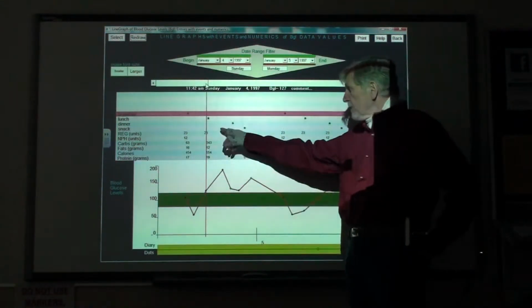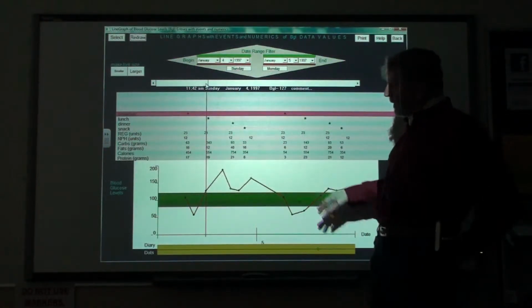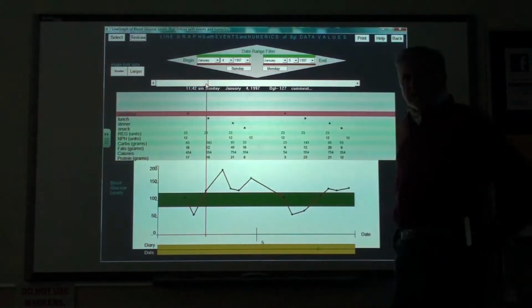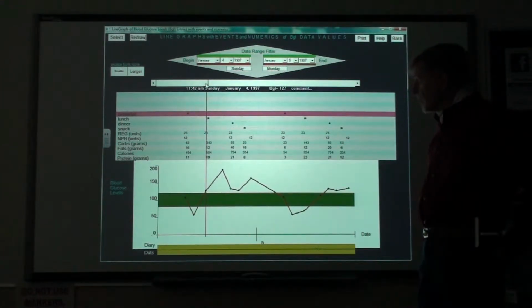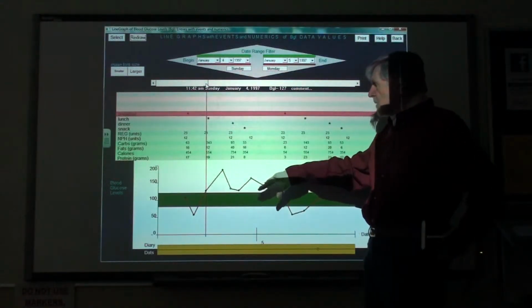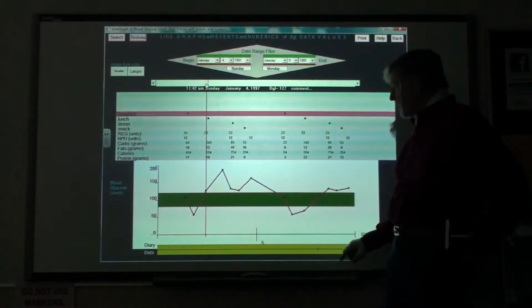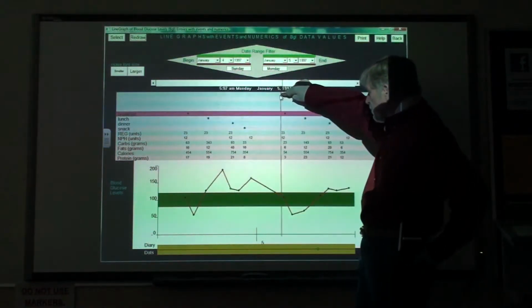And the short-term insulin was not dosed to handle that amount of carbohydrates. The insulin is dosed to handle a prescribed amount of intake that you will have, and you must adhere to that both on the side of the insulin and on the side of the intake to attain the balance. As you see, the body digests the carbohydrates, the long-term insulin has its effect, and the readings come back down. And they continue to be fairly acceptable until the next morning.